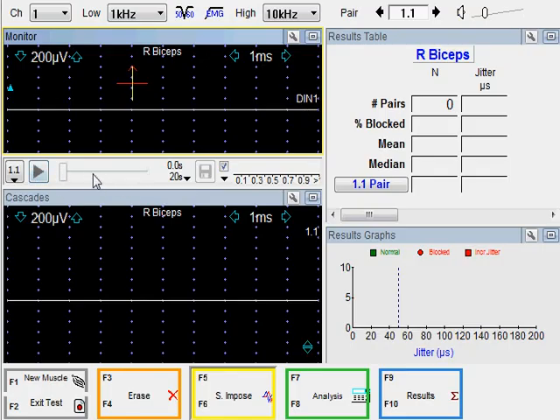Below this, we have controls for the live play as well as the quality control. This is going to show us the rise time of the potentials in milliseconds, so 0.1, 0.3, 0.5, and so on. In the bottom window, we will see the traces that are collected for analysis in a triggered mode. These are called cascades, and we are going to superimpose those traces.